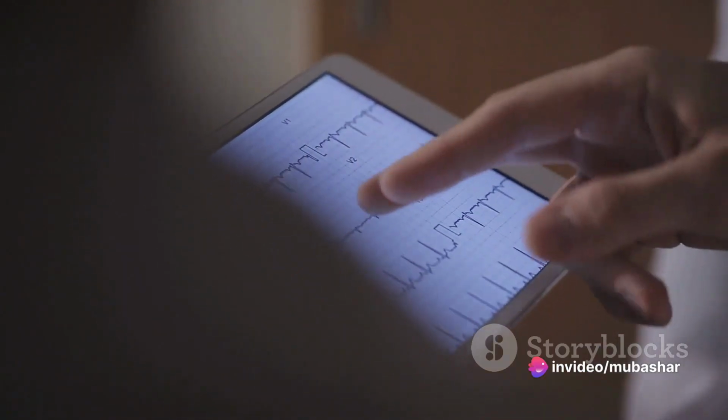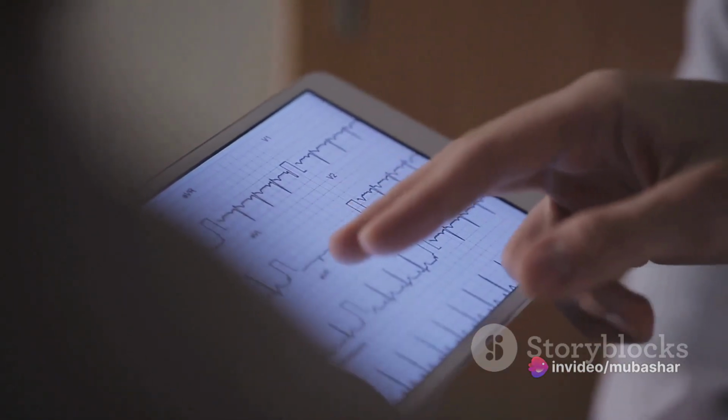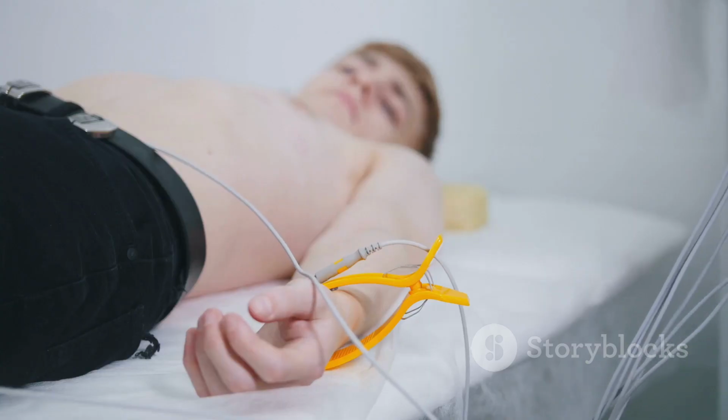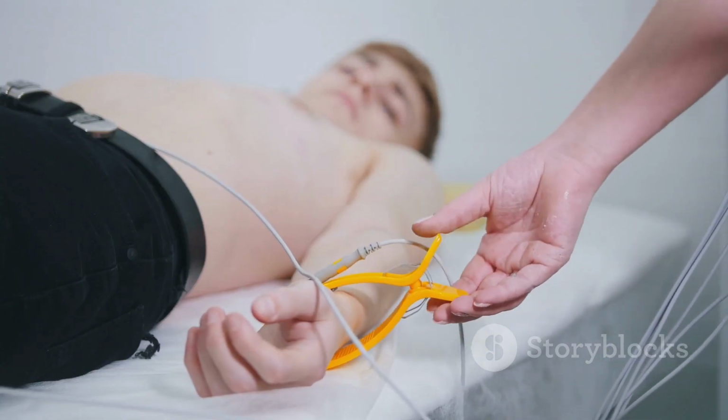So, to recap, we've covered assessing the ECG for rate, rhythm, axis, intervals, waveforms, and chamber enlargement. We've broken down the assessment process into easy-to-understand steps, from understanding what a normal heart rate is, through to identifying different rhythms, evaluating the axis, examining the intervals, and identifying potential congenital disorders. With these steps, you can methodically assess an ECG with confidence.